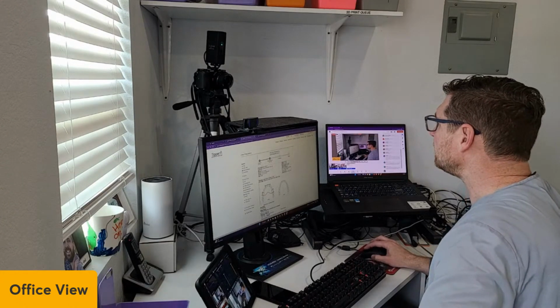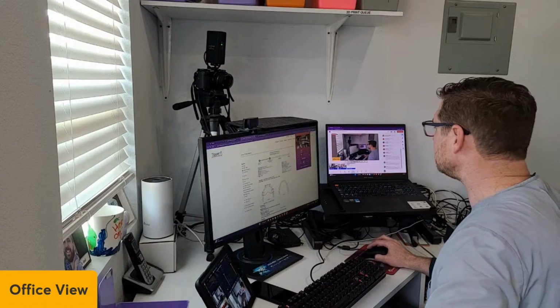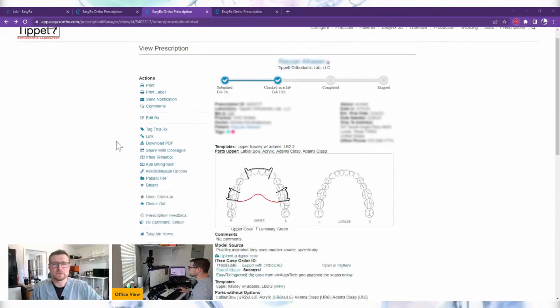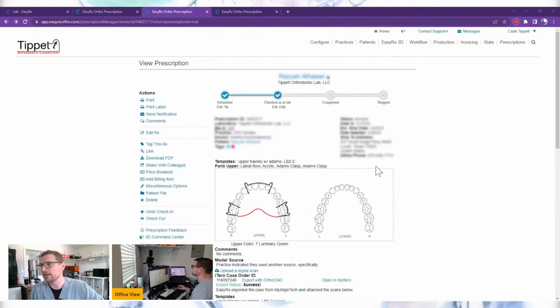All right, so I think I have gotten it everywhere. All right, so now I can do my screen here, and so I have now tagged it. I have printed it. Again, this process goes really quick, and then I send it to the 3D Command Center, which is auto base. Now this is an extra. This is what would I call this? An extra step, an extra cost module.